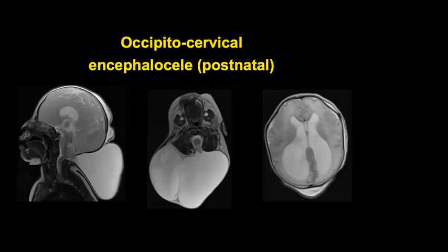And that's the postnatal picture for the patient. Basically the same finding with the encephalocele, and then atrophic or very hypoplastic cerebellar hemisphere and vermis, and even the brainstem, and it's all attracted to the encephalocele.